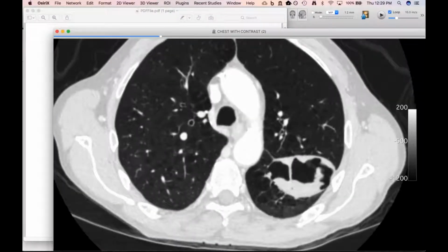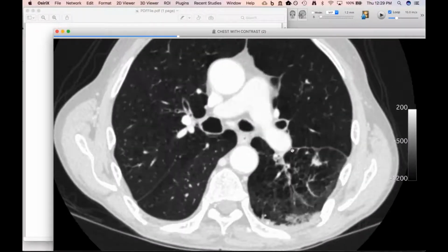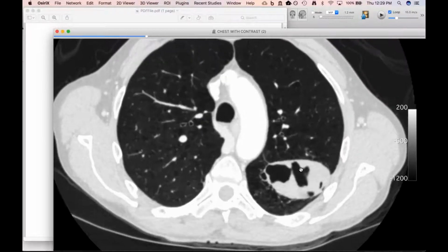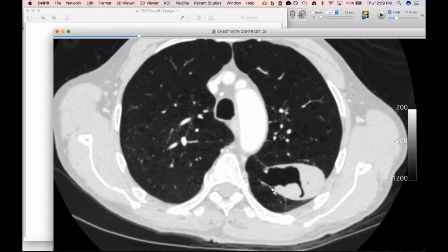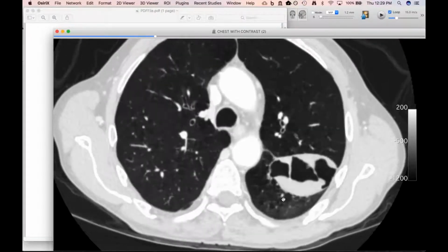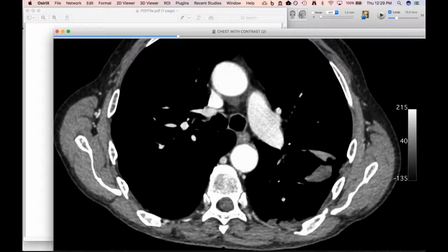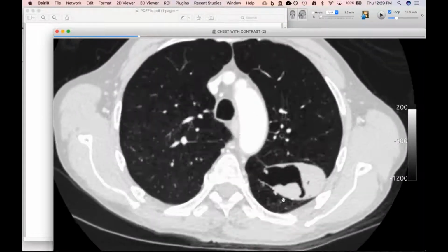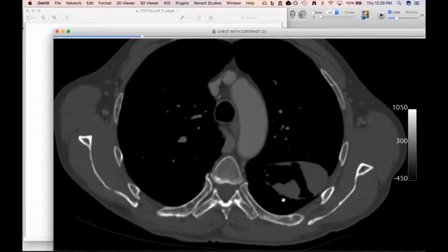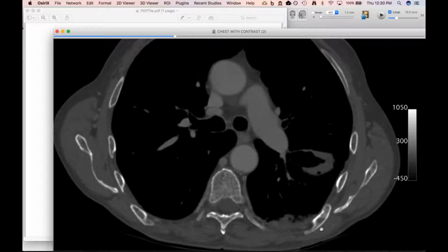So I guess maybe it's just an old asynchronous injury that happened before that just happened to start to resolve and ended up in an airway somewhere and started draining. But that's really weird. No, there's no hint of a stab wound or something to the chest. I know there's no history of that. No, there's nothing, and there's no acute fractures on the left side either. Just this old one back here.